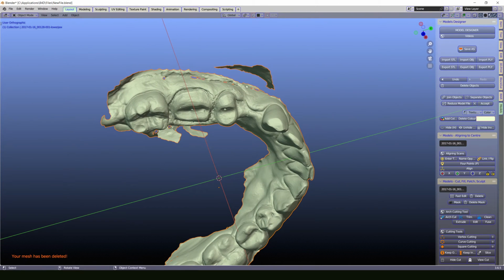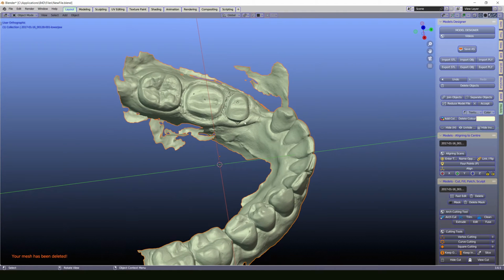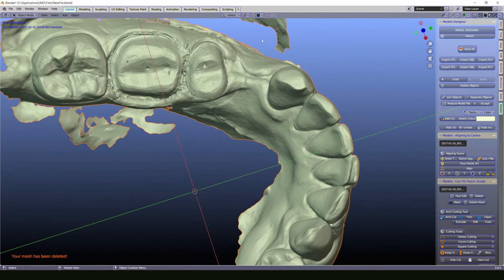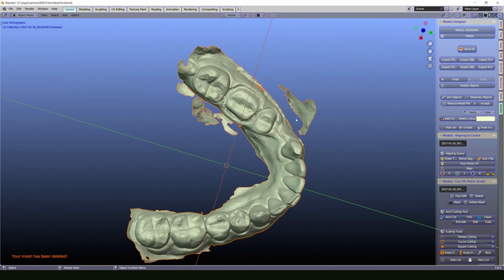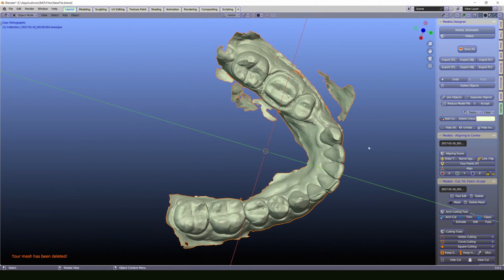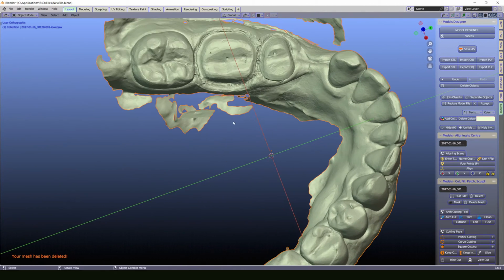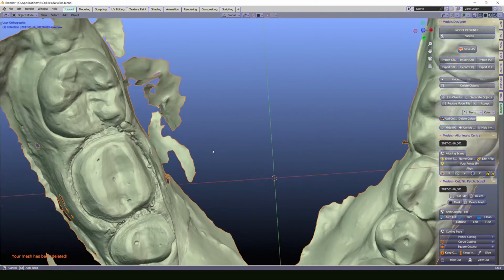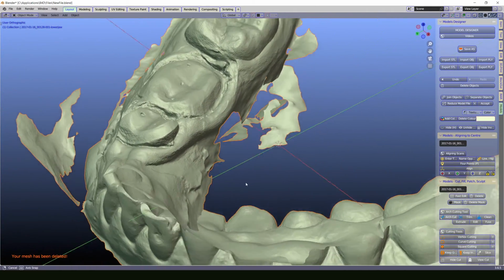I will leave this floating. I will show you how to get rid of these. Do not try deleting it, that is wasting time. The most important thing is that we are not connected to the master file. Let's call it the master, the mothership, the master file, which one we need. And all these strange artifacts, let's call them just rubbish.